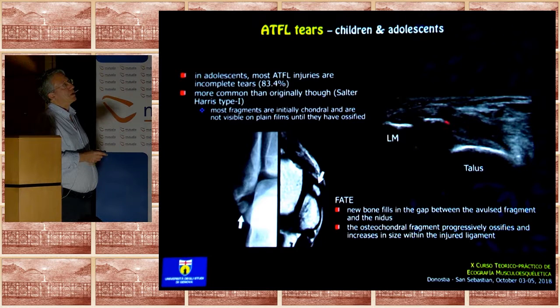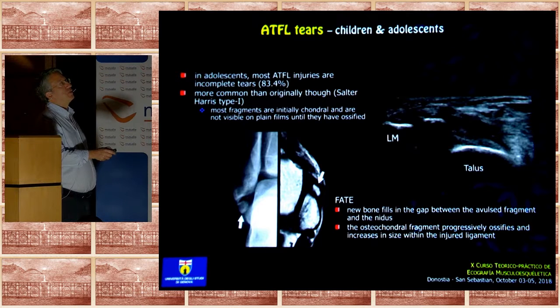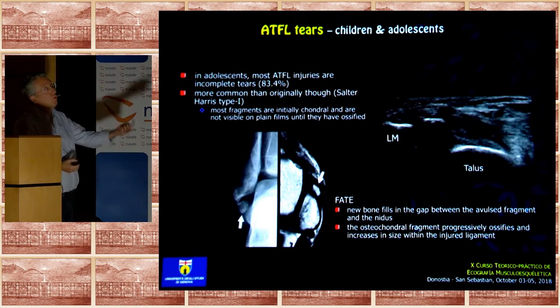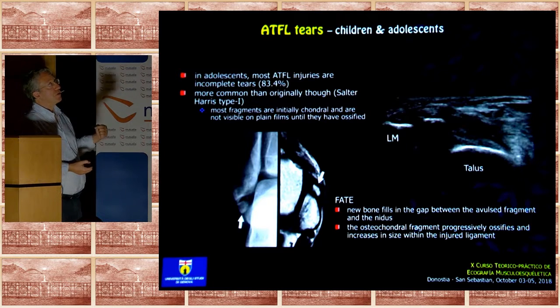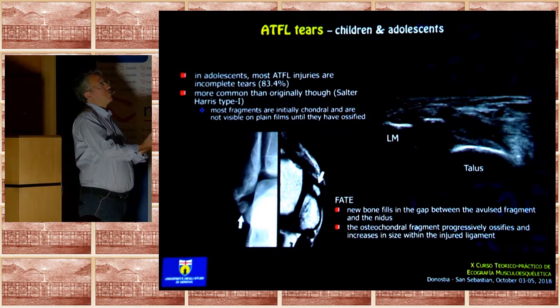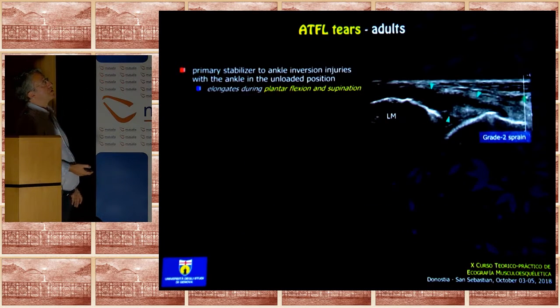this one, in which the ligament may be more or less normal, but anyway not really torn. And within the substance of the ligament we demonstrate ossicles. And they appear not as avulsions, but just ossicles. One typical example is the os subfibulare, that is clearly and very commonly recognized on radiography. And in these cases, the ossicle derives from old avulsion injuries in the children age group, with some migration of the cartilage, some disruption of the cartilage at the level of the attachment, and then ossification of it, forming fragments.